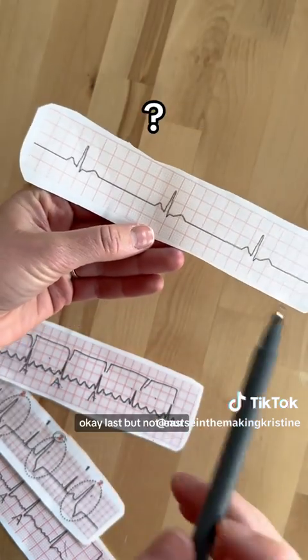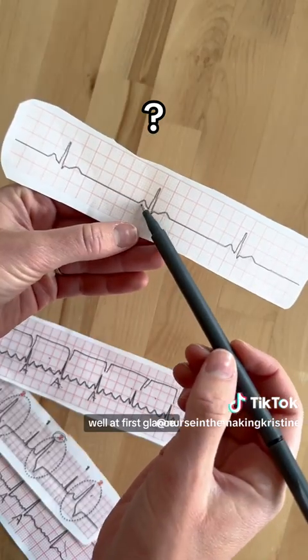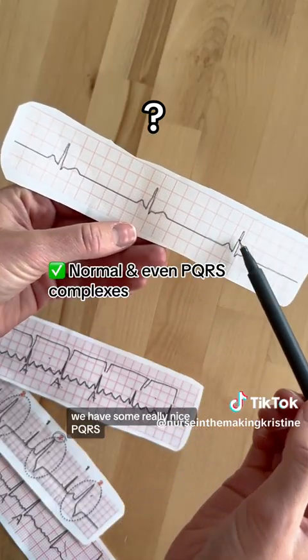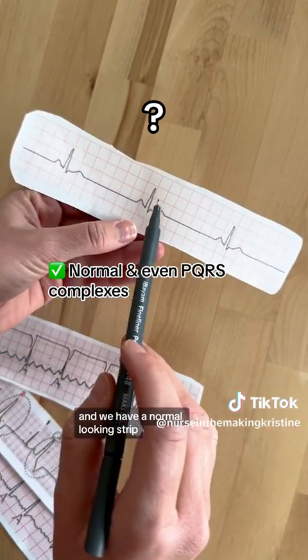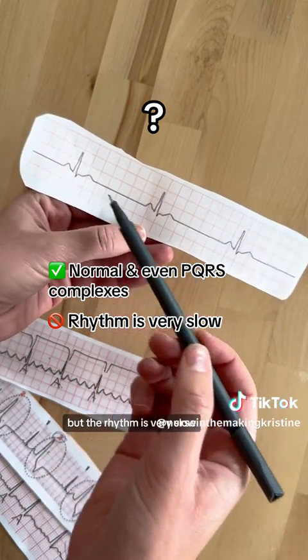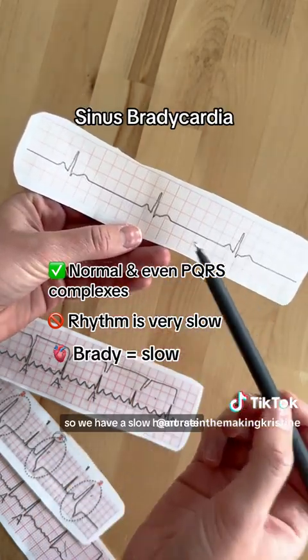Okay, last but not least is this strip. Does anybody know what this is? Well, at first glance, we have some really nice PQRS complexes that are nice and even, and we have a normal looking strip, but the rhythm is very slow, making this sinus bradycardia. Brady means slow, so we have a slow heart rate.